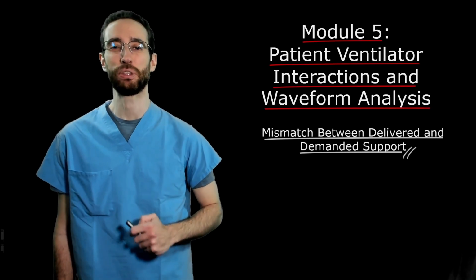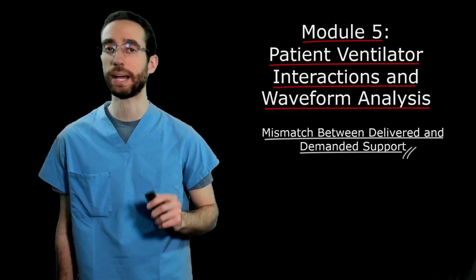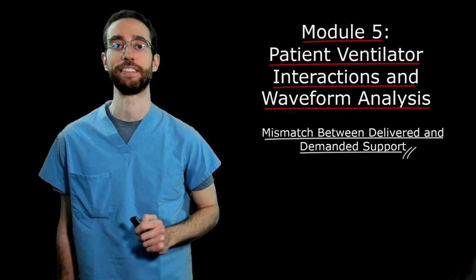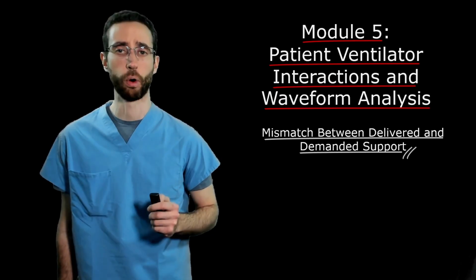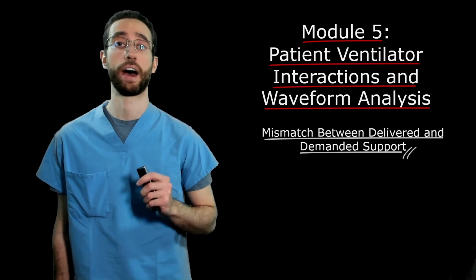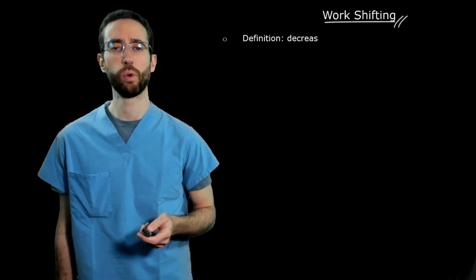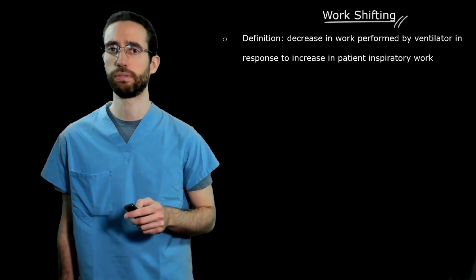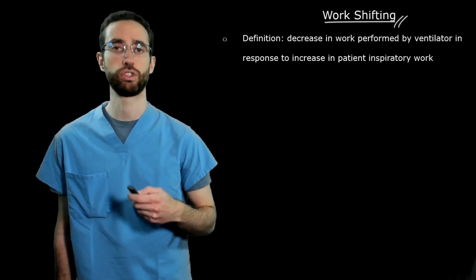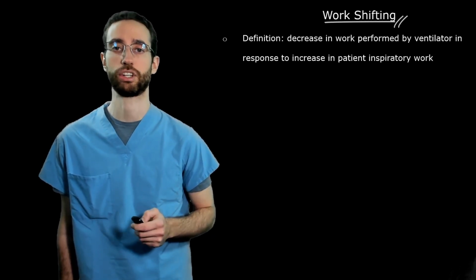Hi, today we'll talk about identifying a mismatch between the amount of support delivered by the ventilator and the patient's demand. This mismatch can be noted in any mode, although modes where work shifting occurs are more prone to it. As you may remember from Module 2, work shifting refers to an expected decrease in the work performed by the ventilator in response to an increase in inspiratory work exerted by the patient.